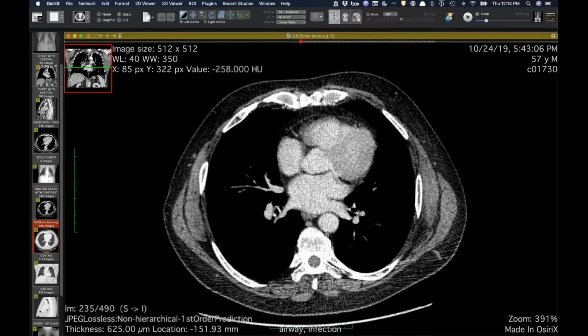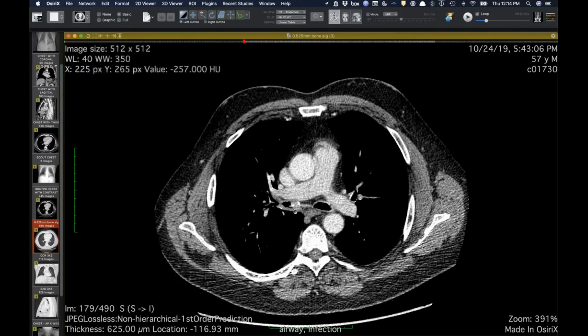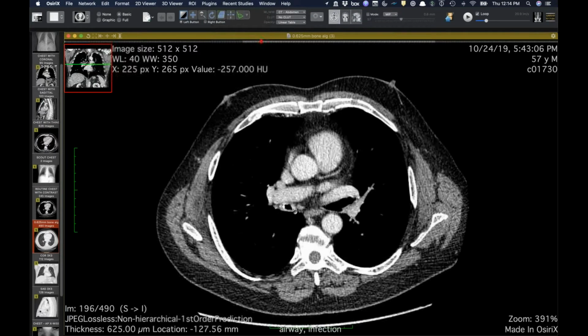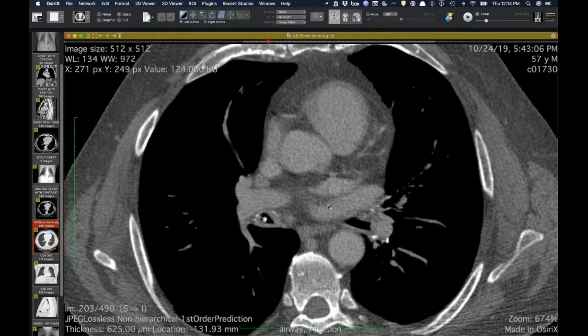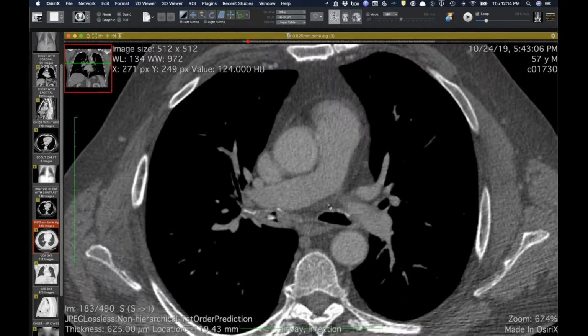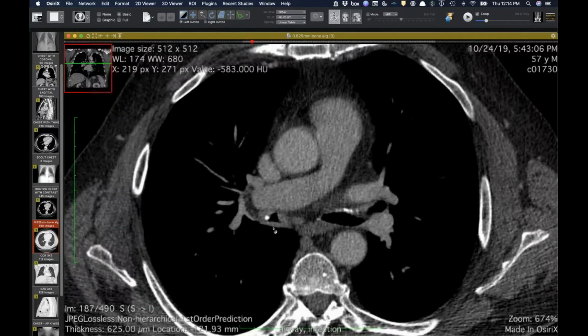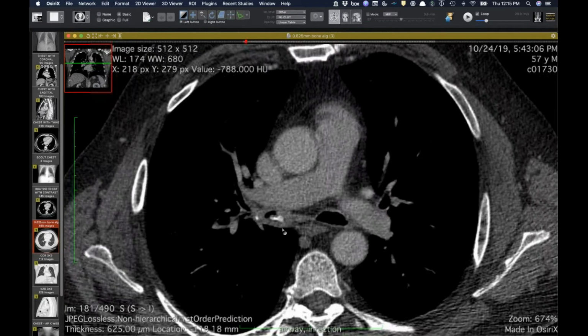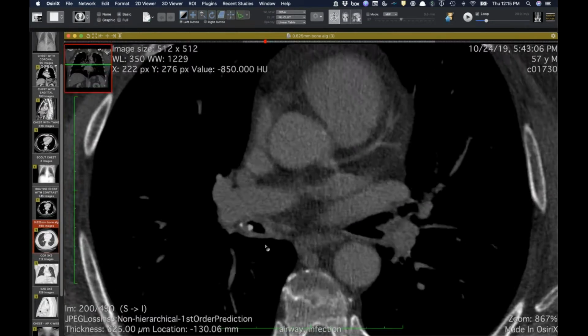And this is before they do a repeat bronchoscopy. And now you can see it's a lot of the granulation tissue and everything else has decreased. And the first guess that we had was it a wire or something, or a piece of metal? It's pretty thick. But when you window it, you can see that it almost looks like it's hollow in the center.